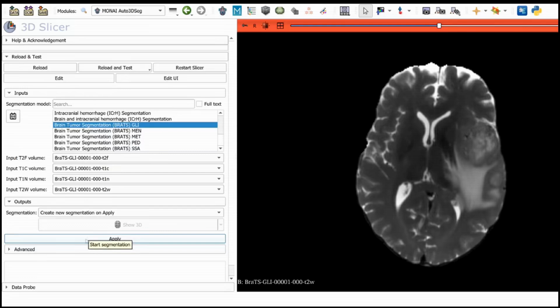Yeah, so if there are publicly available data sets, and most of the models that are available there, I trained them just to show how you can do that and how you can consume it. Yeah, good point. If I click here, I basically start to download the pretrained model and run inference on that. And this is everything locally, so I'm not using any server for this. It's not a strong computer, but it will take a minute.